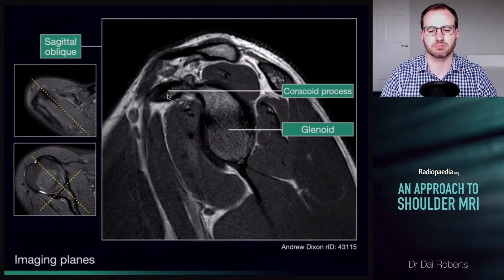If the scan is uploaded in a different way, that bony prominence is going to be a constant. So that'll help us decide what's anterior and what's posterior, and we can see some of the rotator cuff muscles coming into plane here, such as the supraspinatus, the subscapularis with its multi-pennate appearance. We've got infra, and then teres minor.